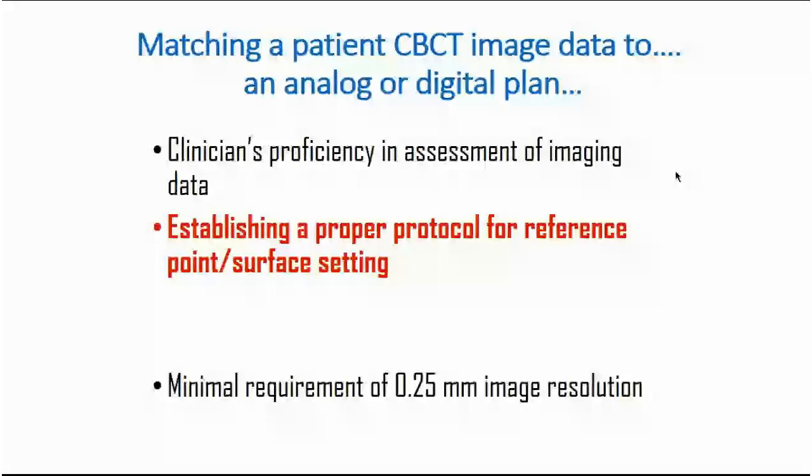We have requirement that we need one jaw full CBCT scan, which should have at least 250 micrometers, or quarter of a millimeter, image resolution, so it could be properly used for the image assessment. So when the computer is encountering this CBCT volume for prosthetic instance, if we do not know anything, this is completely black space for our computer.